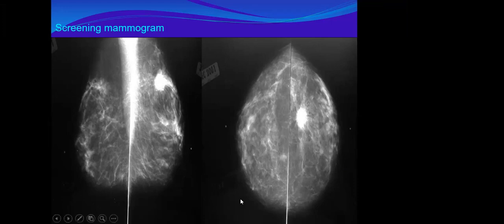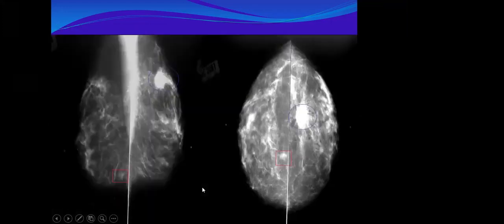Yes. Try to trace the same line. We said if you have seen a lesion, go from the nipple. If you draw the line like this, you need to go along the same line. Take the same line from here, from a bit here, in the lower part. Yes, posteriorly. So it's an area of focal asymmetry.